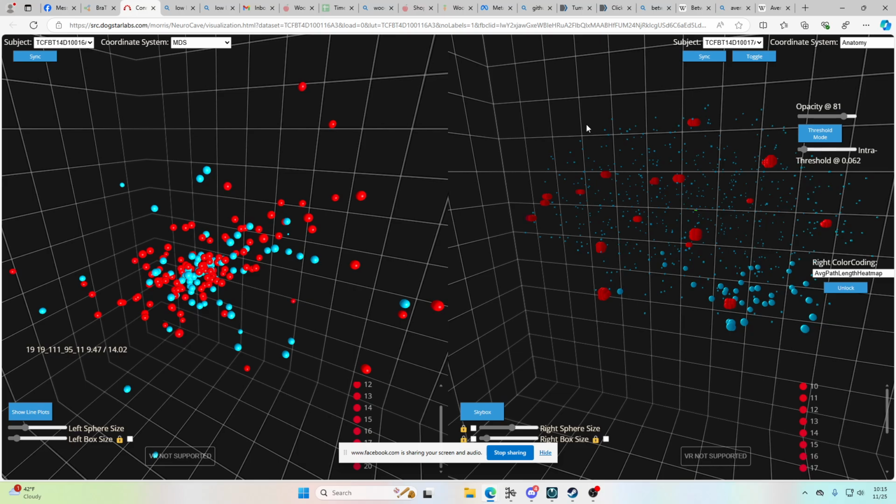In this use case, my aim is to compare the mesoscale of a human brain with a macro-scaled human brain, with the mesoscaled voxels in the micro environments of the tumors in those regions.